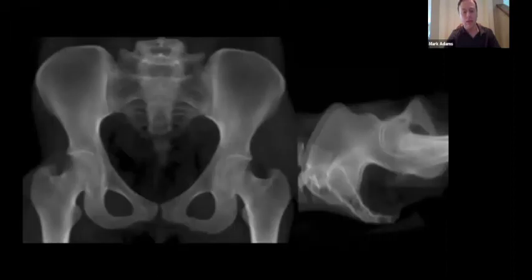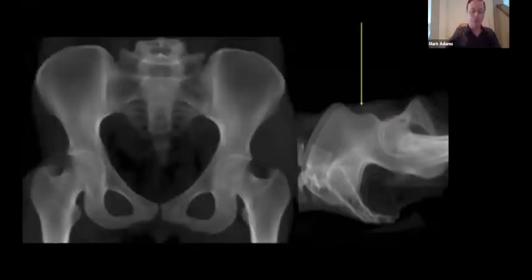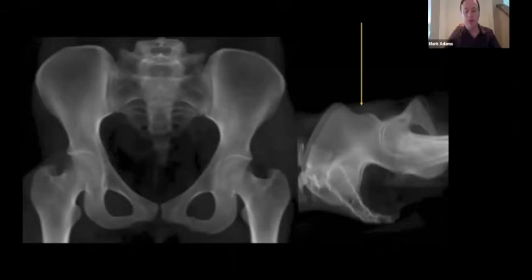The AP pelvis is generated with the patient in the supine position. The beam naturally is perpendicular to the patient. A well-centered AP pelvis anteriorly consists of symmetric obturator foramina, symmetric teardrops at the bottom of the fossa, and a symphysis that is midline with respect to the sacrum.